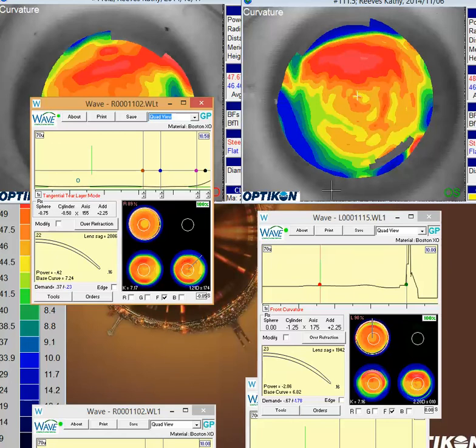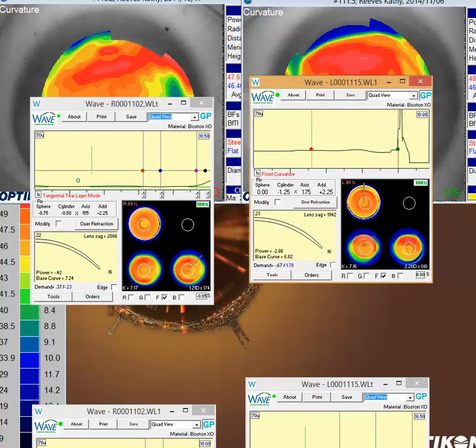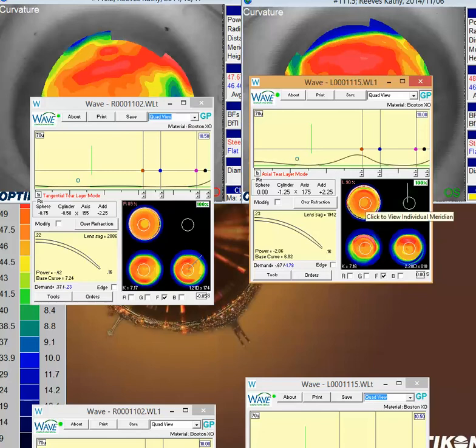If we look at the left eye, similarly you'll notice that in your design, we look pretty nice here. Here you have some areas where you get some bump ups, and quite often what I'll try to do in these designs, I'll try to look at that placement of that red dot, and sometimes I'll try to maybe center it a little bit in the center part of that elevated area. So I might tend to bring this one down a little bit here to a little smaller back surface OZ.